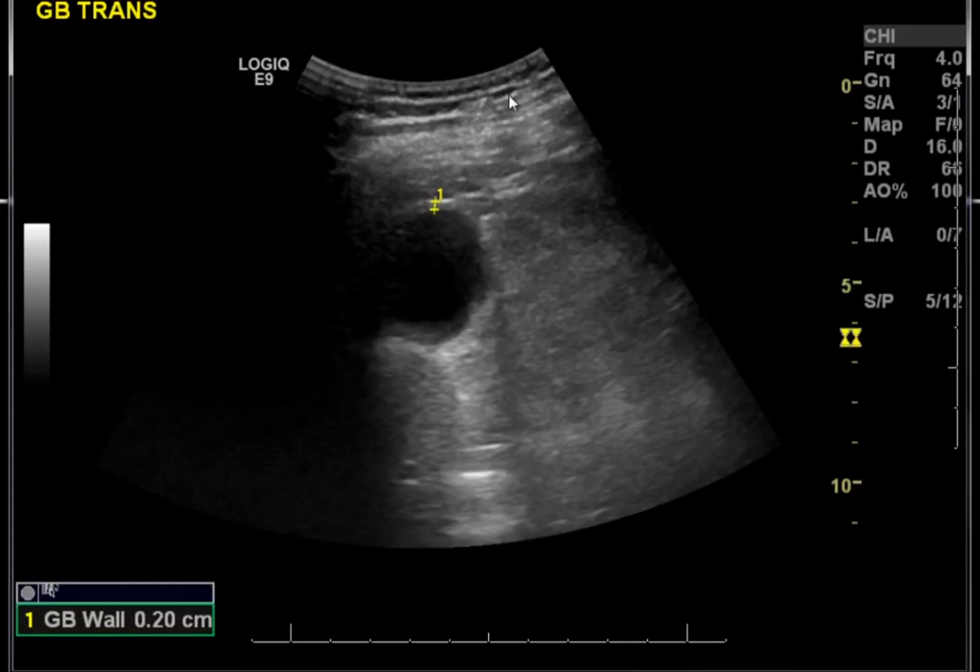That's because the system is calibrated to increase the strength of the sound pulse as it goes into the tissues, the sound waves. So no attenuation has occurred here. So the strength of the ultrasound signal is very strong. It did not undergo attenuation, so there is acoustic enhancement. And here is one area where the sound was attenuated.